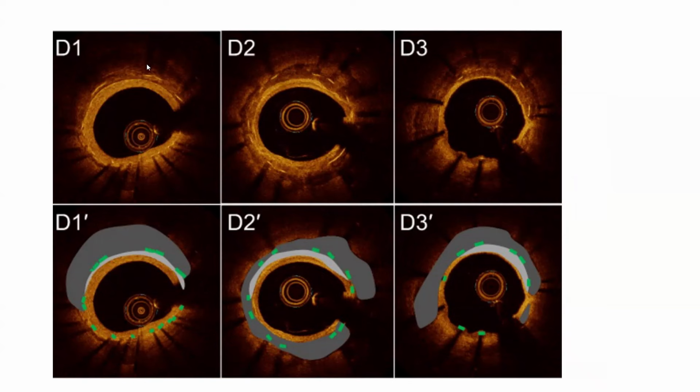But importantly, you see also calcium behind the stent. So this is calcified neoatherosclerosis inside the stent struts that's connected to calcium outside the stent struts in the original atheroma. This is calcified neoatherosclerosis as an extension of the persistent calcium behind the stent struts. Maybe the persistent calcium is penetrating into the neointima. That could be one mechanism of calcified neoatherosclerosis, although it's not well established.